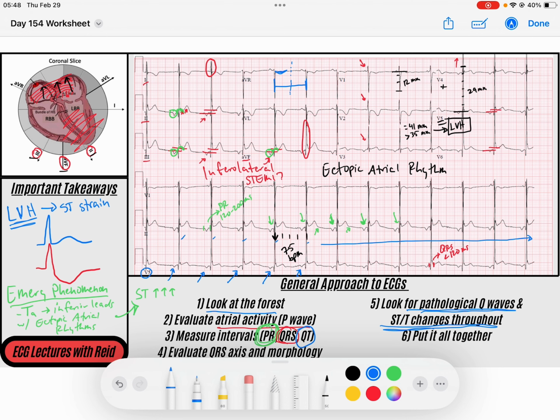And so this patient fell in that bucket. They were older, they had risk factors. Some of their previous ECGs might have had a little bit of subtle changes compared to this, so maybe we were thinking there were some new changes. It was really difficult. We actually took them to the cath lab, and they had an occlusion of the right coronary artery, which ties in well with this mostly inferior STEMI with a little bit of low lateral involvement with V5 and V6.